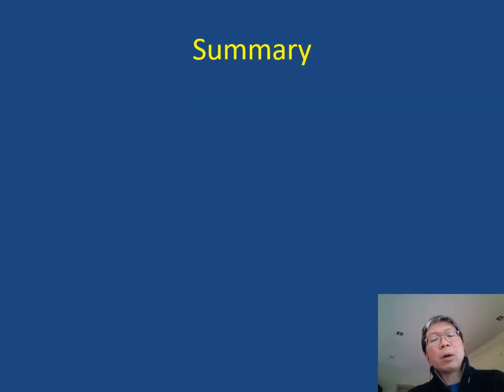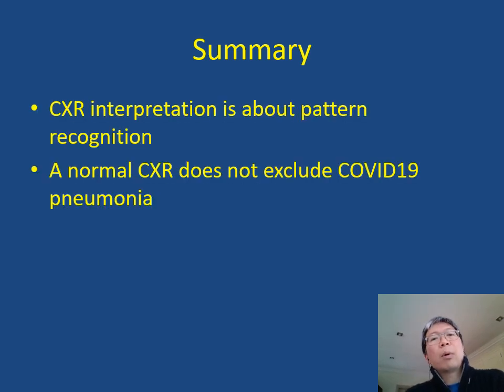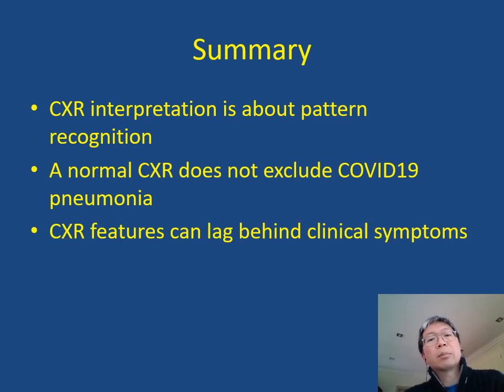In summary, I hope to have shown you that chest X-ray interpretation is really about pattern recognition. And we can all do this and develop greater familiarity that will help to guide our decision making in this time. However, a normal chest X-ray does not exclude COVID-19 pneumonia, and sometimes chest X-ray features will lag behind the presentation of clinical symptoms.